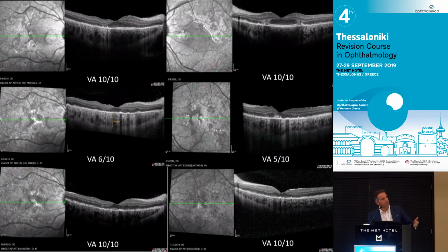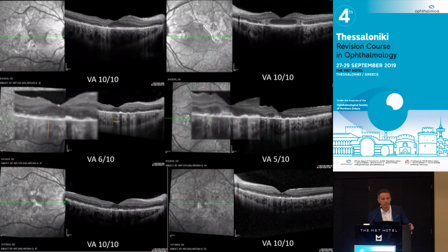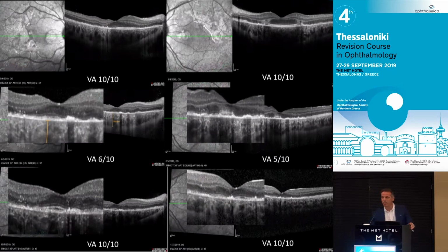However, at the end of the follow-up, which was about 5 months, we could see that it recovered again, which is quite remarkable, to 6/6. And now we have the OCT to observe all those changes in the outer retina, and we can see that it is severely disrupted there, but it's recovering. There's some sort of, I wouldn't say regeneration, but recovery of the ellipsoid.